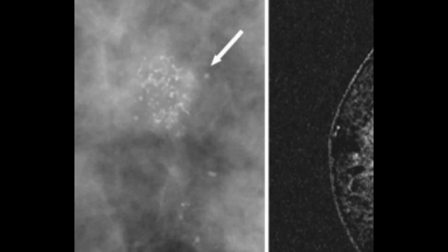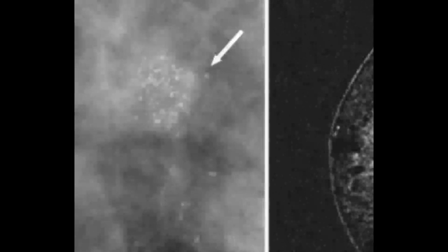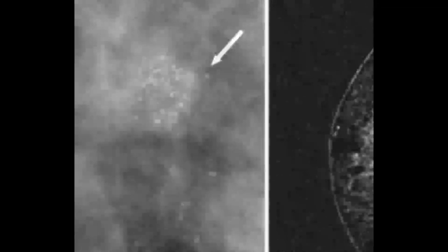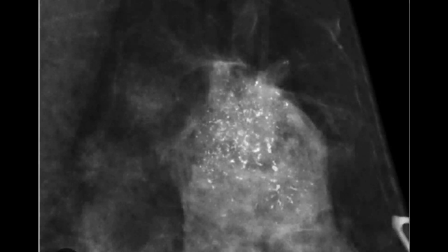The greater the number of microcalcifications, especially associated with ductal carcinoma in situ, the greater the risk of invasive disease. This is a worthwhile point to note: the greater the number of microcalcification flecks, the greater the risk of invasive disease. Here on this image again you can appreciate that these are fragmented, linear, may be rod shaped, and branching.